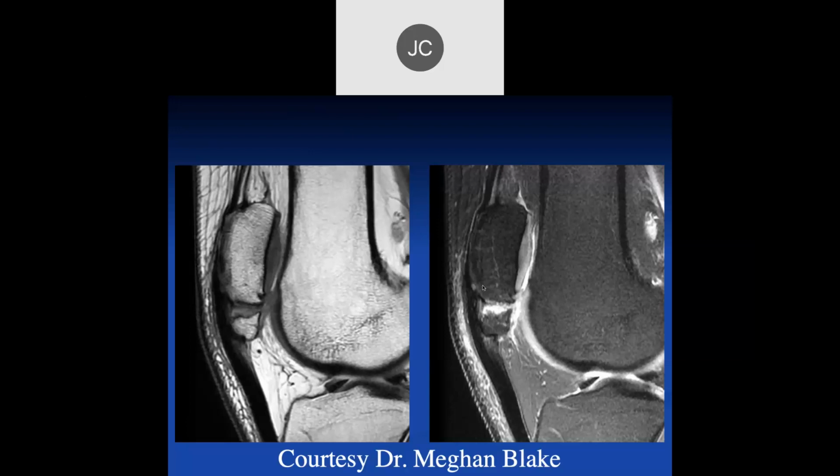Here's a transverse fracture of the distal patella. It looks like much of the patellar tendon is intact though. Yeah, on this one that quadriceps expansion is still intact, but you see a fracture right here. And it looks like it's probably going through the inferior articular... well, I don't know. It's hard to say. This may just be the inferior pole, and the cartilage may still be intact superior to it.